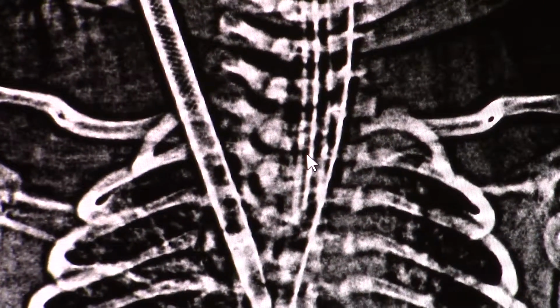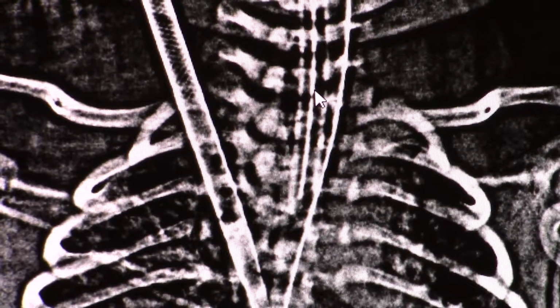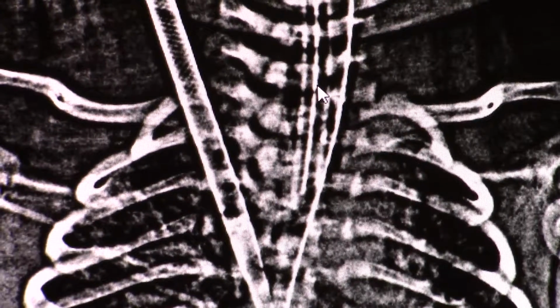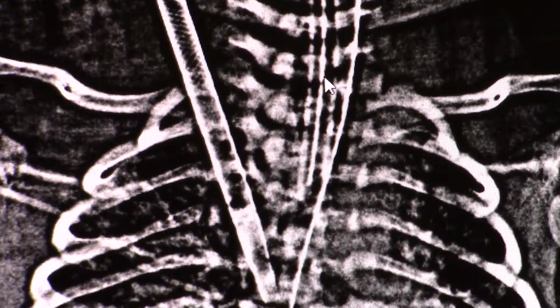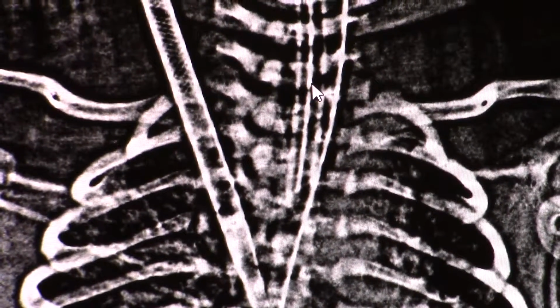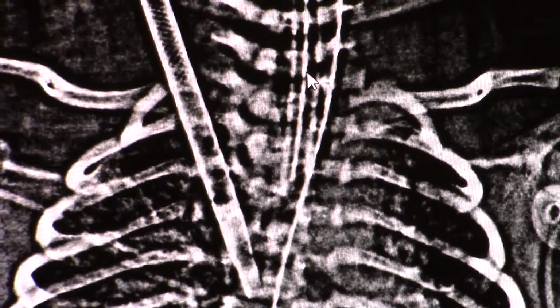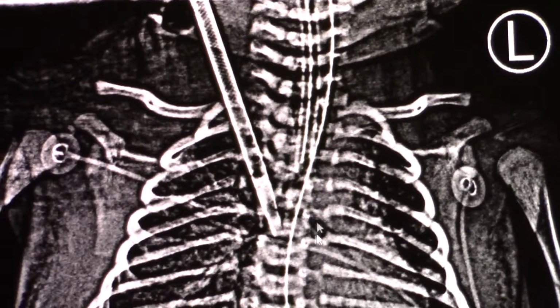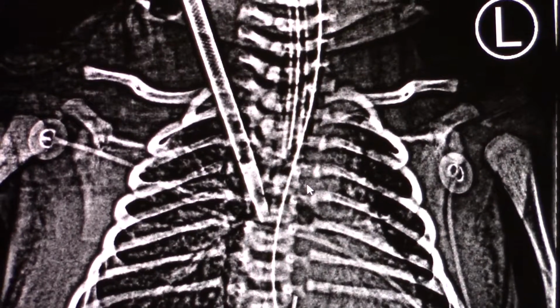So knowing that, let's say the tube is sitting at the tip of T2 here in the neutral position, and you measure and you've got 1/2 centimeter before you're at T1. That kid might be in danger of extubating should we pull his head up after we shoot the x-ray, or we put a shoulder roll in him, or we put a shoulder roll and turn his head to the left. It's going to change the tube position, and you're already closer than you need to be in relation to it being too deep.